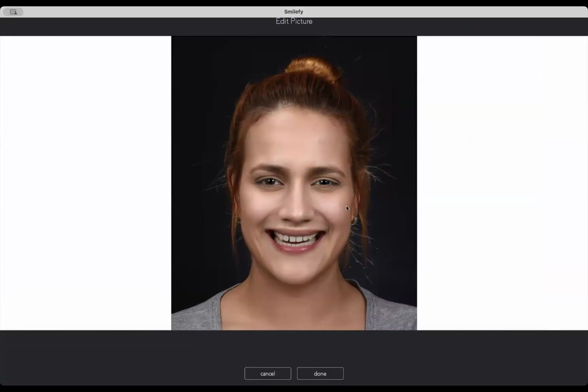We have a big smile, we have the entire face, so don't try to crop the face, we need a full head, and the shoulders are in the frame. That's good enough. The picture is not too big, so we don't need the full body in the picture. We need only the head, a little bit of shoulders, and a big smile so that we have enough space in the mouth to design.